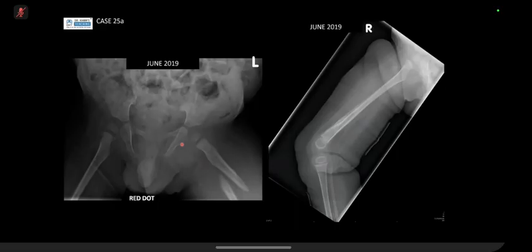Okay, next case. This is a difficult case. So you can ask me questions, or I might give you hints. So we've got a series of studies. It's a story case, okay? So have a look at the first X-ray. Tell me what you see. Just tell me what you see, but don't give me a differential first. Then I'll show you other images.